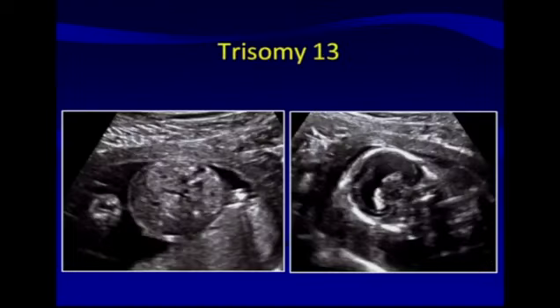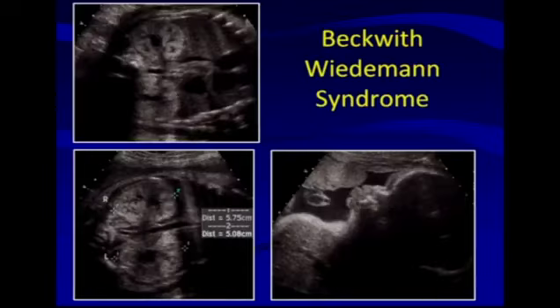Now, here's an example of enlarged echogenic kidneys. Here we have a transverse view of the fetal abdomen with these large kidneys sort of coming way in front of the fetal spine. And this was seen in association with holoprosencephaly in a fetus with trisomy 13. And here's a kidney. It's very remarkable how large and echogenic these kidneys are. You can see in this fetal abdomen how big these kidneys are, measuring over 5 centimeters. That's larger than a kidney would be in a full-term baby at birth.